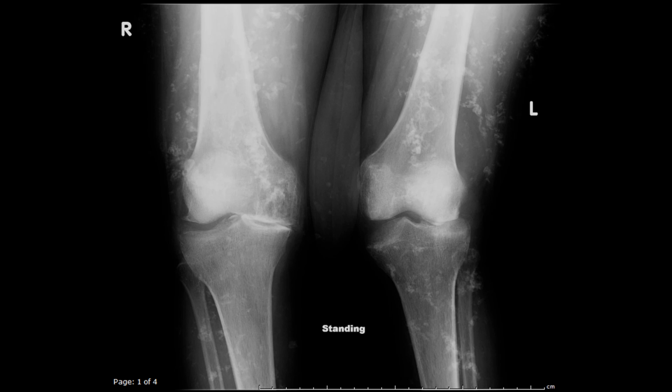Also in MRI, as I said, you could see fatty infiltration or increased T1 signal intensity within the muscle, which means that it's atrophy. But too much death can end up in calcification, and diffuse calcification in the soft tissues is something we also see in dermatomyositis, but in the chronic phase.